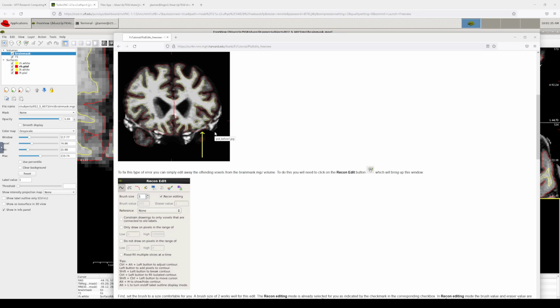So you look at the brains as you acquire them. You look at this initial output from FreeSurfer, but then from there, there need to be some decisions about quality. Some can have much worse quality, others are going to be just these subtle issues like this. So here you can follow these instructions.